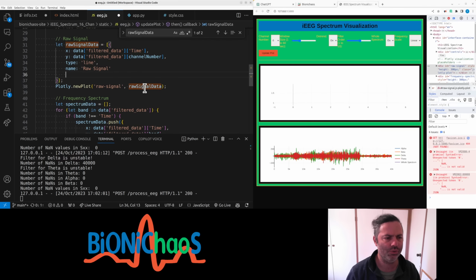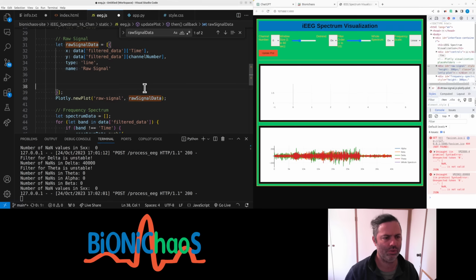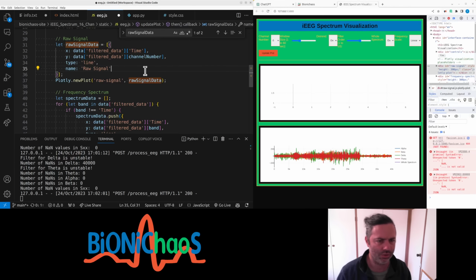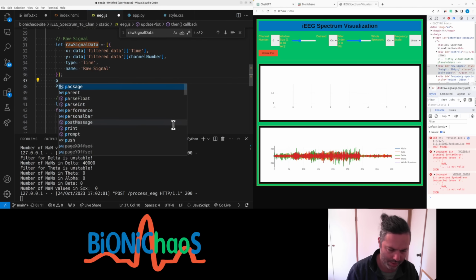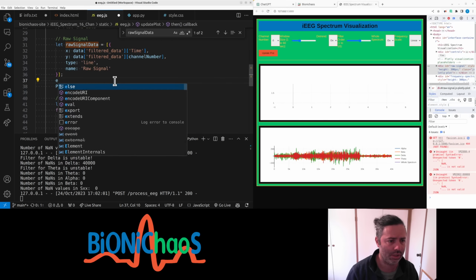Need to make sure Copilot is not suggesting anything at all. Oh, come on.